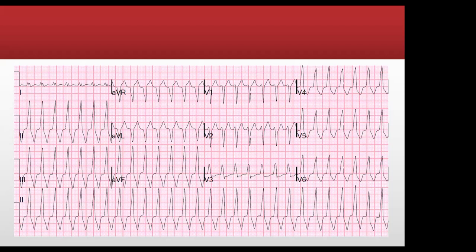And the Josephson notch, close to the nadir of the S wave. Yes, Joseph. Okay, thank you. Yeah, well done. Thank you.